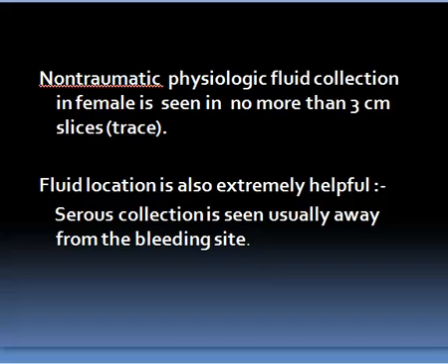Remember the sentinel clot. Sentinel clot means blood near to the organ involved, but serous fluid means it is away from the bleeding site. So this is called non-traumatic physiologic fluid collection. In the female, normally you can find it in 3 consecutive slices, and it is usually serous.